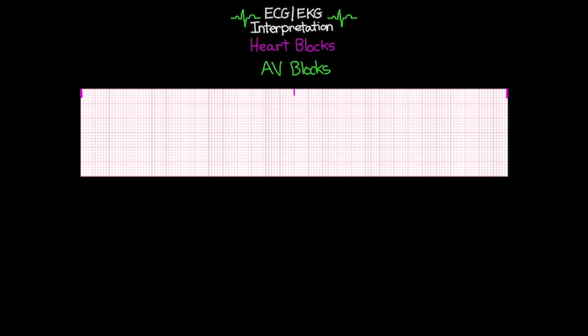And these are going to be the typical heart blocks that you guys are going to encounter and have to be able to identify. Now, these blocks are the ones that oftentimes will cause people trouble when they're trying to analyze these rhythms. They definitely can be difficult, but hopefully by the end of this lesson, you guys will be able to better understand these and understand what's happening and truly be able to identify each of them.